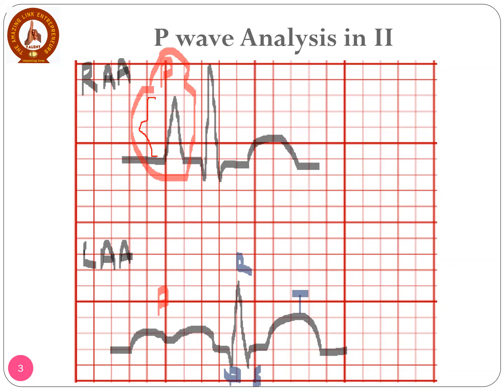So this P wave is abnormal. It has a long duration. Look at the duration, it's long from here to here. The duration is more than 0.12 seconds. For this index case, 1, 2, 3, 4, so almost 5, the duration is more than 0.12 seconds.